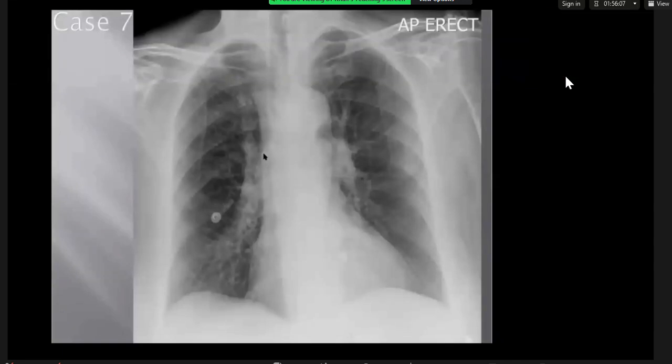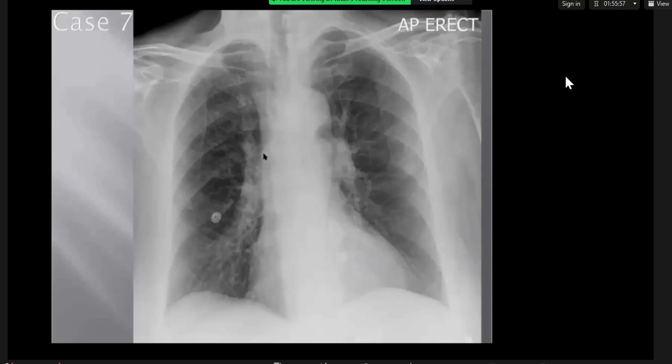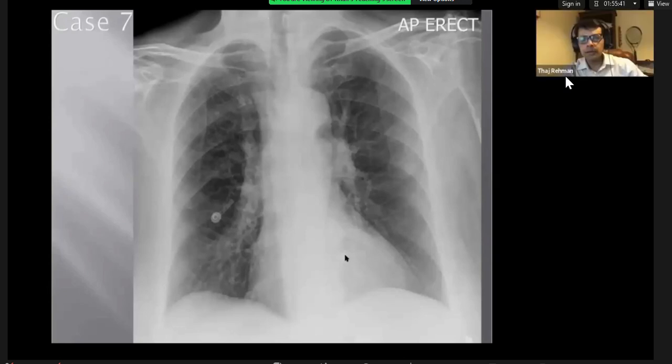All right, so I'll continue checking the bones. Bones are fine. All right. So I think projected over the left scapular angle, there is an opacity, a rounded opacity. Very good. Yeah, and another one retrocardiac. It's a bit medial. Yeah, I think that's that one there.